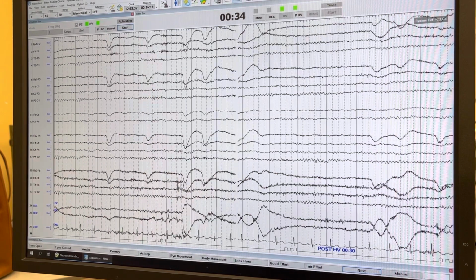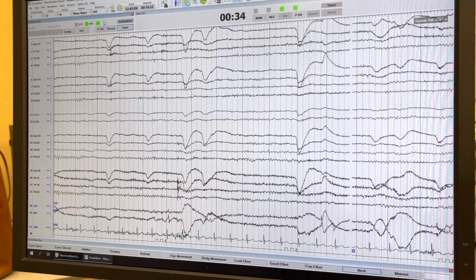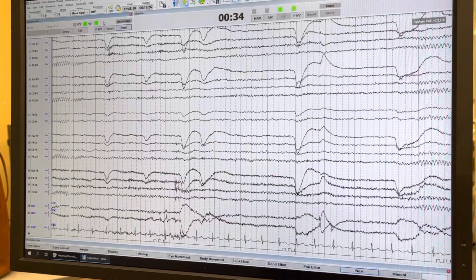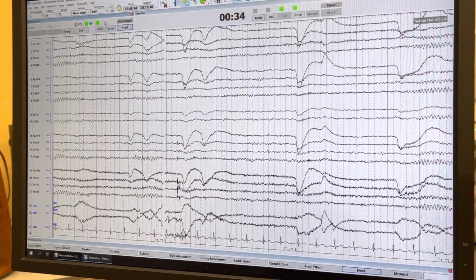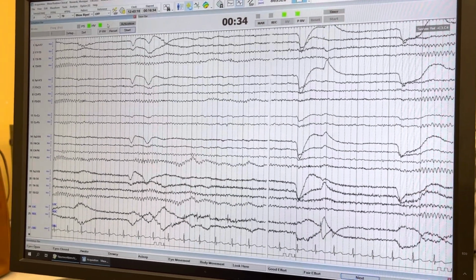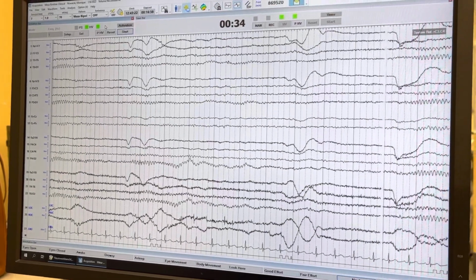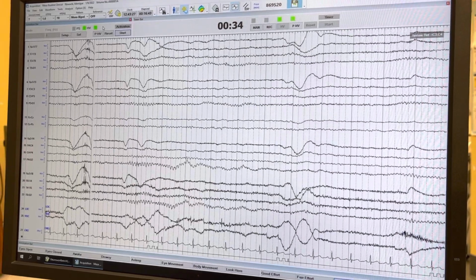Now, before you start the recording, you have to actually plug that in. Can you guys, I hope you can see that top. Okay, let me just. Okay.